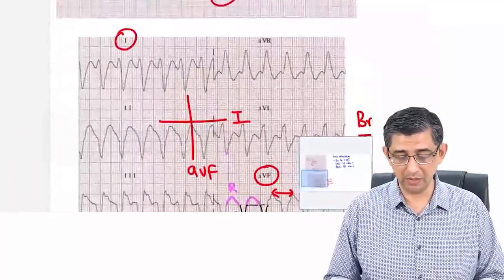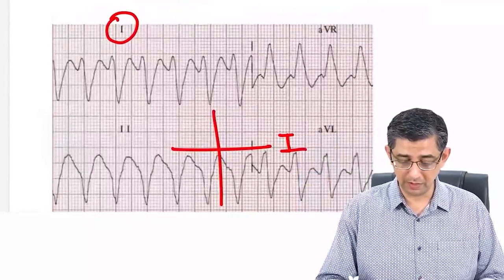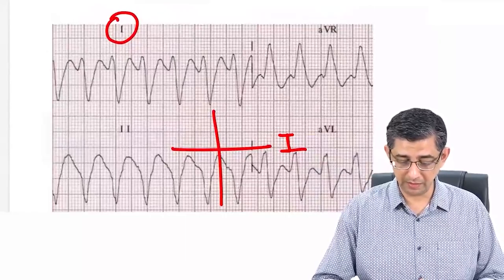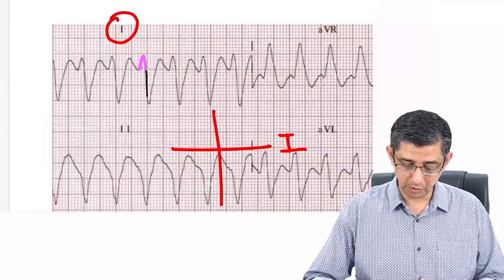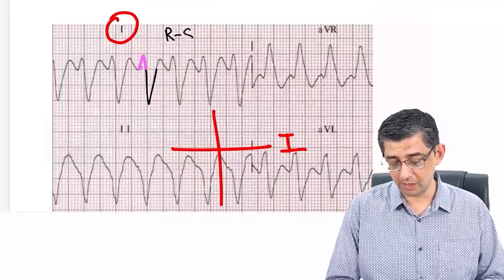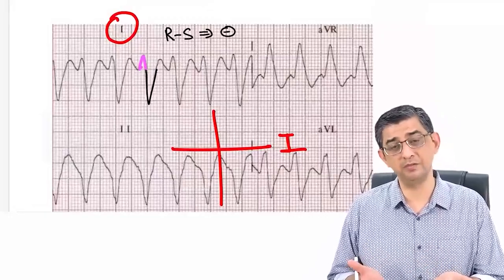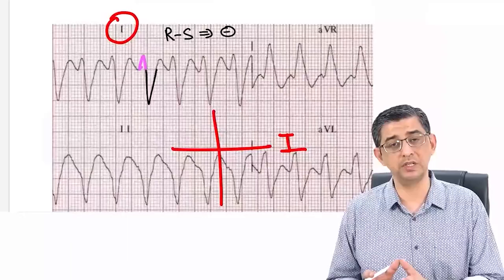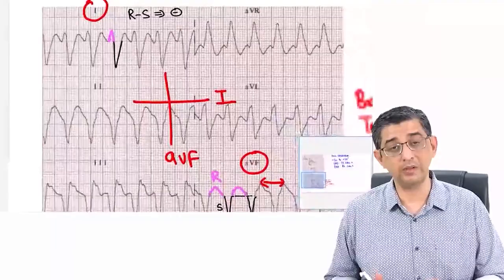Let's look at what's going on in lead 1. Again, the same story. The positive wave, which I'll highlight with a different color, is the R wave. If you compare with the depth of the S, huge disparity, no? So again, R minus S will turn out to be negative. I can actually count the number of small squares, but it is a futile exercise. After all, I just want to see the average vector, and it's turning out to be negative. So let's just plot this.